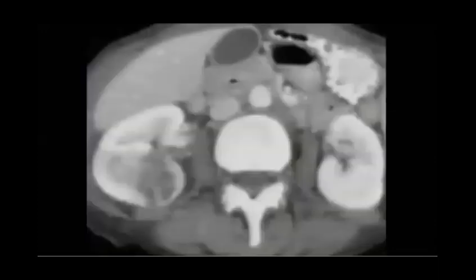And maybe I can show you this one, which is similar. You can see again a focal lesion. Sometimes it's confusing, like renal cell carcinoma or others. So take care. One of the good differentials is abscess. Sure, the clinical picture here will be helpful. If this patient has any clinical history of predisposing factors for abscesses, then you can think about it. Okay? Yes, sure.